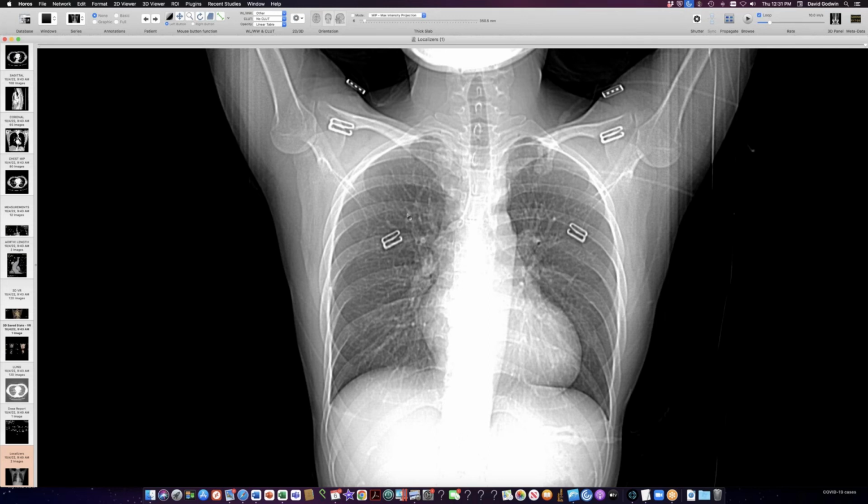One of the important things about notching is, first of all, we don't see it very often anymore because most people get interventions early enough. But often the lower part of the rib thins out and tapers, and you can't see a distinct cortex on the lower surface of the rib. So a lot of people overinterpret that and call it notching. But a true notch actually has a sclerotic boundary, so you'll see thickening of the cortex and a curved indentation in the lower surface of the rib.